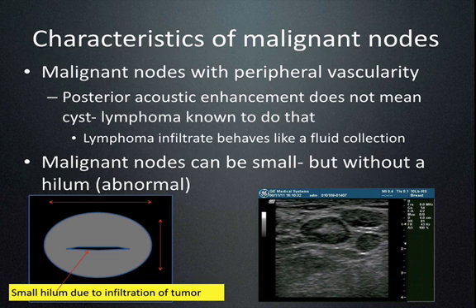The representation of the lymph node in the diagram shows a very small hilum. Oftentimes this is a sign that malignancy has infiltrated the lymph node and put pressure on the lymph node so that the hilum actually collapses. On the image on the other side, it looks like there's a fairly normal looking lymph node in the middle. However, you'll see that the hilum is actually pushed to the side, and there are two other lymph nodes, one above and one below, that have no hilum, and one is quite round, although small.